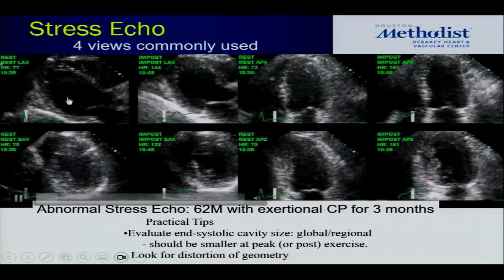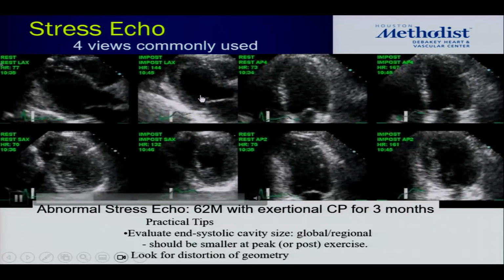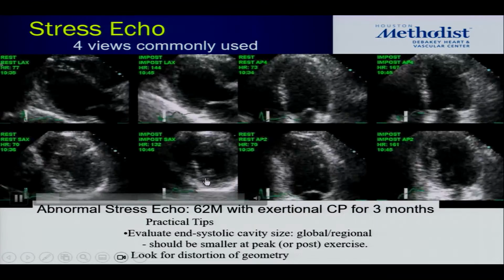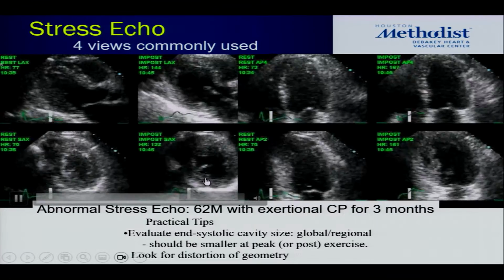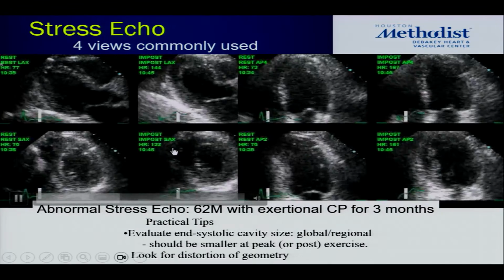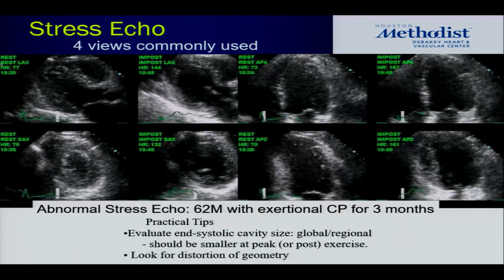Watch the size of this end systolic cavity now, now, now, and watch it here, now, now, now, and very evident in a short axis view. So there has been kind of a diffuse global increase in end systolic volume. Now it's not just the whole cavity, because this is obviously a very prominent case.